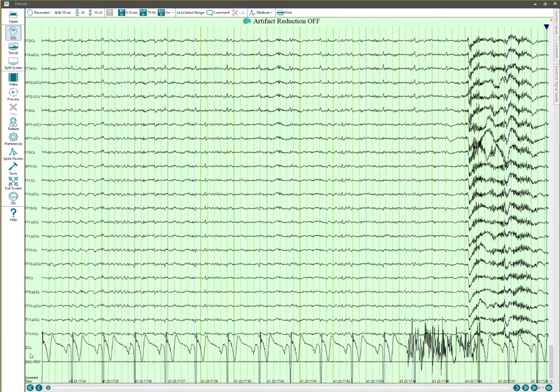So now we've got the channel labels applied, but the very bottommost one is EKG to VREF, and that's flat, and Z to CZ has EKG. So clearly the channel map for this particular recording is different than the way that the channel maps were developed for other locations and from a default template from EGI. So how do we address this? Well, we just have to reassign that label.